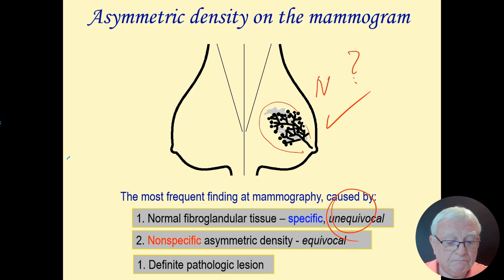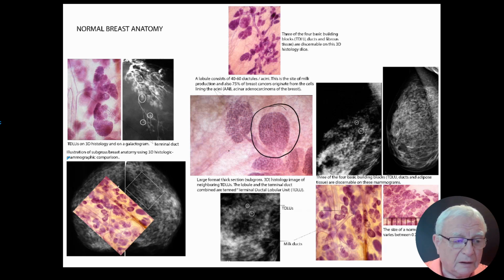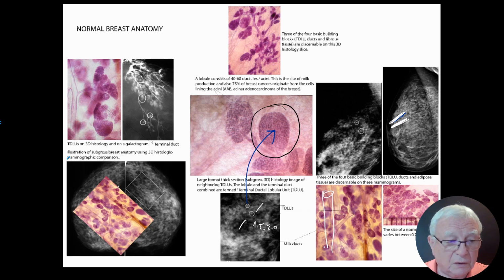How can you be so sure? I wish all of you had this beautiful collage printed up on an A3 paper, laminated preferably, while you are screening, because that teaches you what the underlying histology looks like. But this is what I'm seeing, a 1.5 to 2 millimeter nodular density, radio-opaque. The fat is radiolucent. While looking at the black and white, you are always thinking in color. For example, this linear density here and linear density there, that's a reflection of the underlying major lactiferous duct. This is such a great teaching tool.